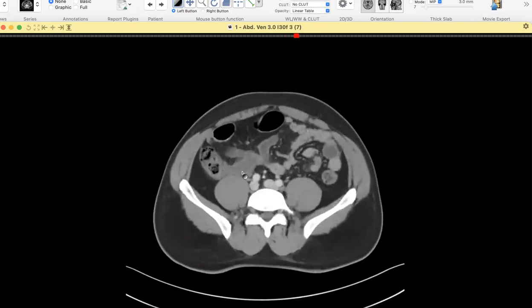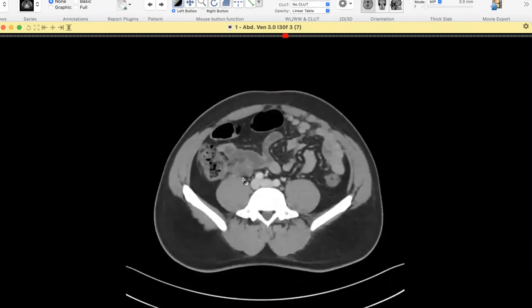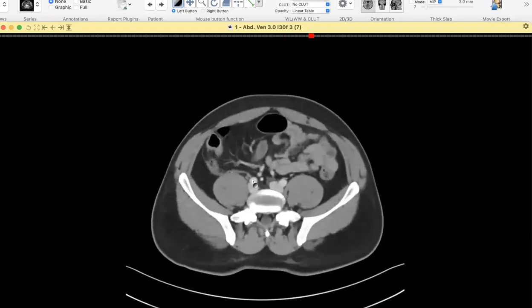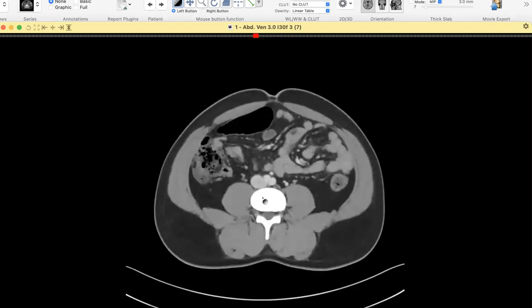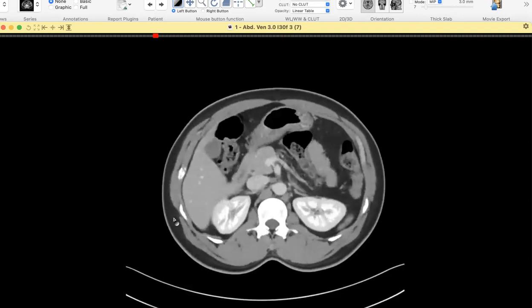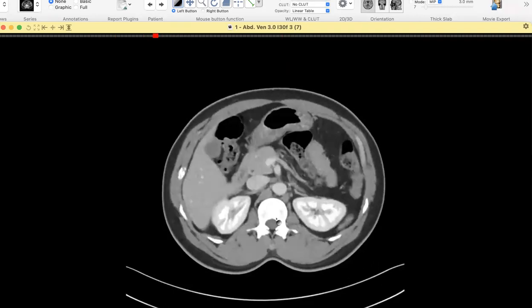However, if there is wall thickening, I think also lymph nodes or metastasis, I'm not sure. But if you see aggressive features, then you can say mucinous cyst adenocarcinoma. Whenever you say a mucinous tumor of the appendix, immediately you should look at the margins of the other abdominal organs to look for any mucinous seeding of the peritoneum, scalloping of the liver, just to rule out pseudomyxoma peritonei.